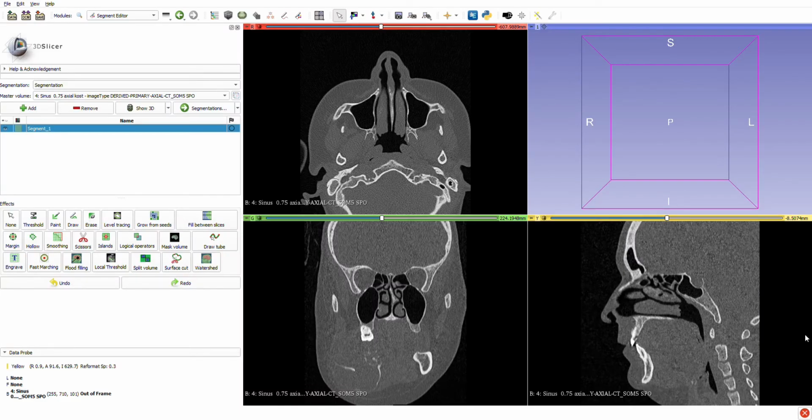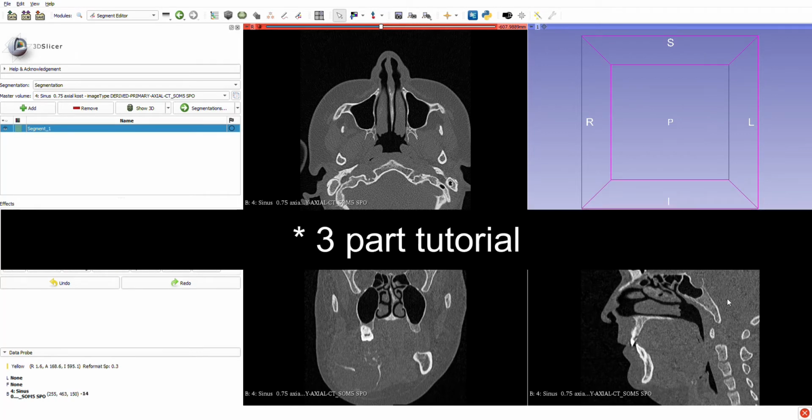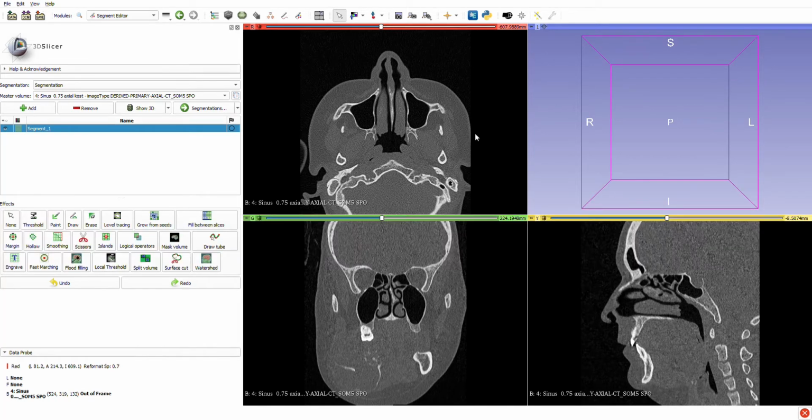Hello everyone, my name is I am a radiologist at University Hospital Osijek in Croatia. In this video, I want to show you the whole process of making the personalized surgical guides for mandibular reconstruction using a free fibula flap with our developed add-on for open source software Blender.